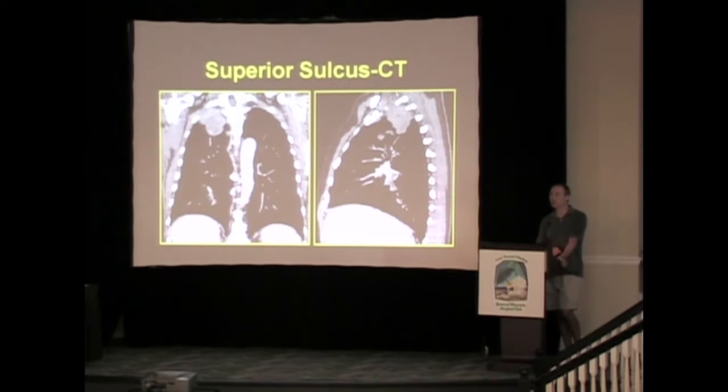But you may have patients with pacemakers or other contraindications to MRI. And just keep in mind that although it's not as good as MRI, these reformation images can give you some important preoperative planning with regard to the superior sulcus lesions.